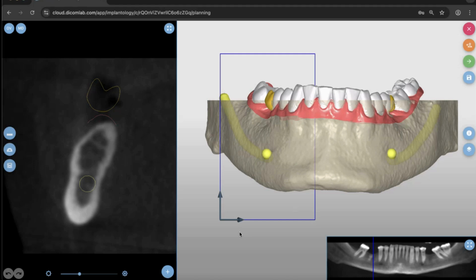If I say OK, then you immediately see that, of course, the colors and the buttons are a little bit different, and maybe some things are slightly different than the previous software. But we tried to keep the main architecture and the main logic of our previous system, since we had great feedback on the ease of use already from that platform.